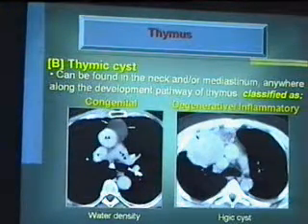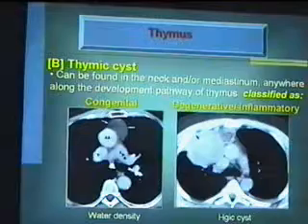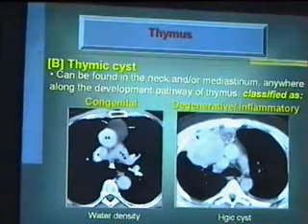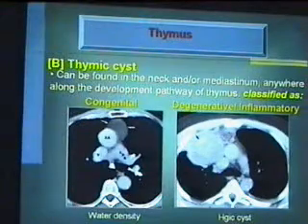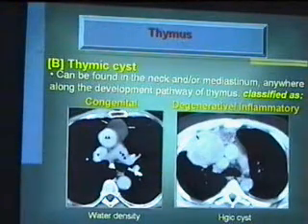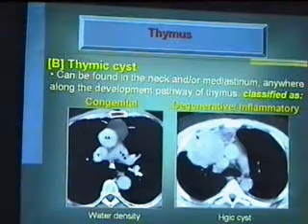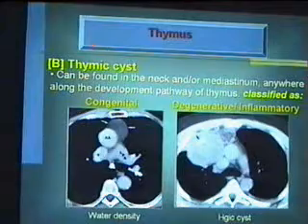Invasive thymoma, can it metastasize? Yes, if it's malignant. We said one third of invasive thymomas are malignant, and when it is malignant it metastasizes elsewhere. Yes. We are done with the neoplasms, the solid neoplasms. Let's go to the thymic cysts.